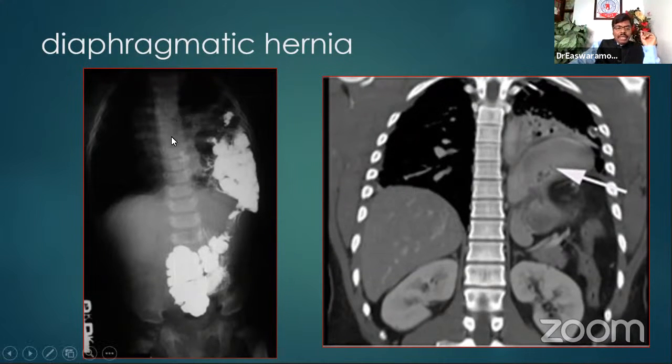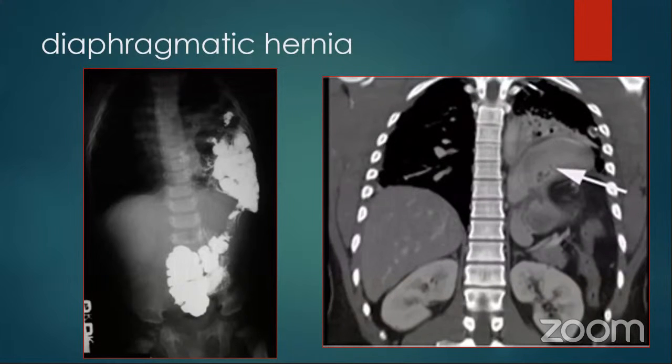You can see the barium gone into the esophagus, into the stomach and various parts of the bowel. As it travels, because part of the bowel is within the left hemithorax, I can see quite a few loops of intestine in the left hemithorax, as suggested by the barium-filled shadow. There are even simpler tests, like putting a Ryle's tube in a patient, where the tube will be seen coiled in the left hemithorax.